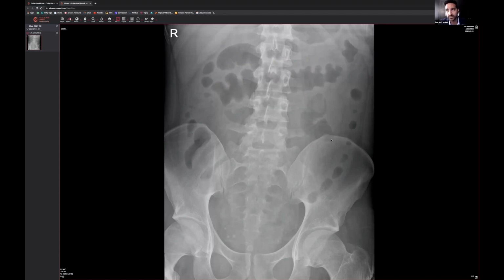It doesn't have to be ulcerative colitis, but it could be inflammation because of infection, ischemia. There's so many reasons that someone could have inflammation of the bowel. But the important thing to understand is that this sort of irregular appearance to the bowel wall contours is not normal, and therefore this would be indicative of colitis. And colitis will therefore lead you down a different road.